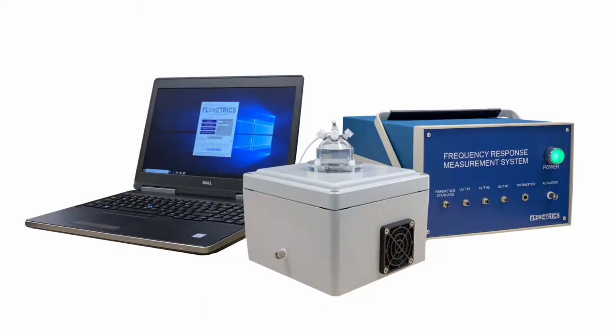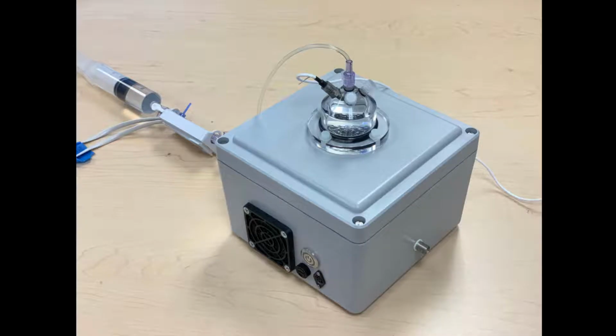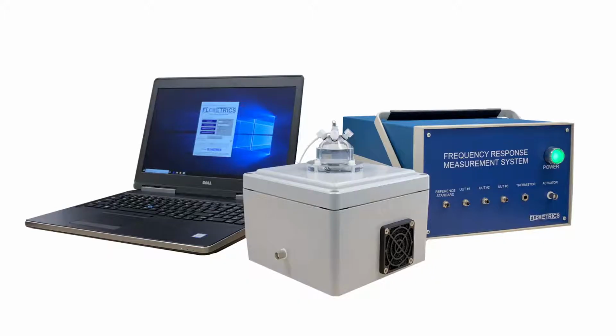This is the Flometrics Frequency Response Measurement System. The Frequency Response Measurement System is a complete solution for testing the frequency response of catheters, disposable pressure transducers, and other equipment. The FRMS contains the full functionality for evaluating the frequency response of a unit under test across a range of frequencies. Alternatively, the FRMS can be used to generate a variety of waveforms and measure the response of each sensor for later analysis.